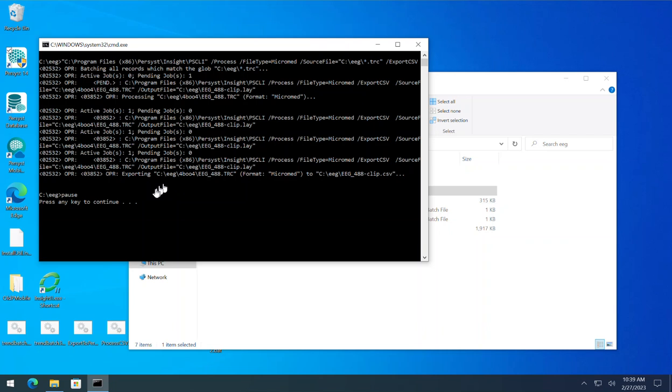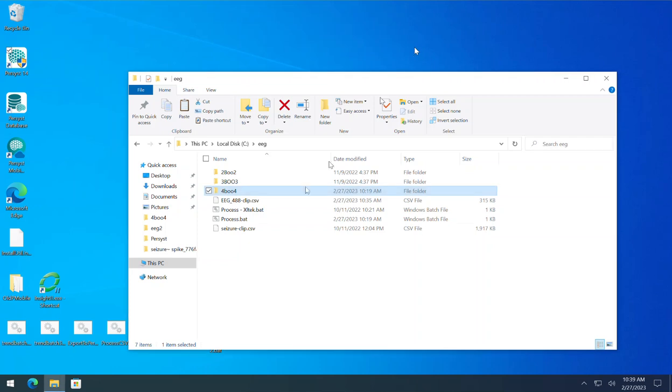Okay, our processing is done. We see press any key to continue. And so we'll go ahead and close this, and the any key, there's an old joke about that. I won't make any funny comments about that, but we'll just close this window because we're done processing.